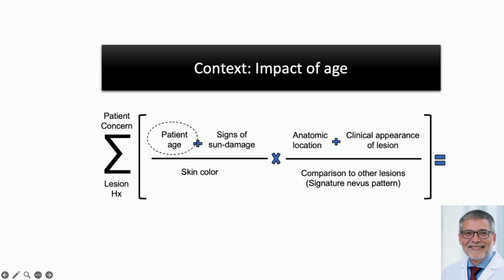The only thing that enters the differential diagnosis for such a lesion is superficial spreading melanoma. And superficial spreading melanoma under the age of 12 to 16 just doesn't occur, okay? So if under the age of, current guidelines are 12, but as I said, it's going to probably go up to 16, it's benign. The older you get after that, the higher the pretest probability that that same exact pattern will be a melanoma, superficial spreading type. And in fact, after the age of 50, 50% of lesions with a starburst pattern will prove to be melanoma, okay?